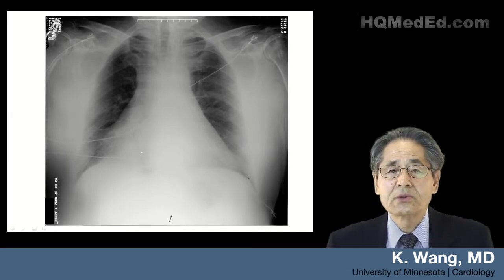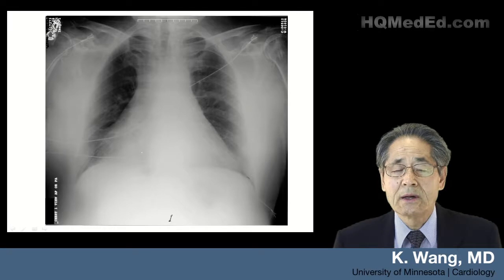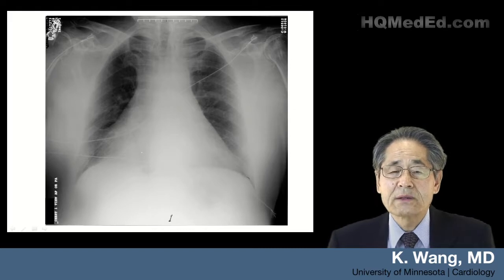Today we are going to share some interesting radiographic findings with you. These are the collections that I made throughout my career. Let's look at the first X-ray. This is a chest X-ray, undoubtedly.